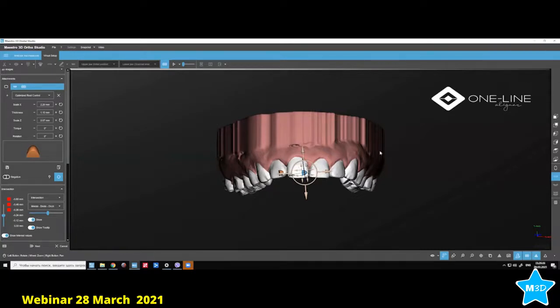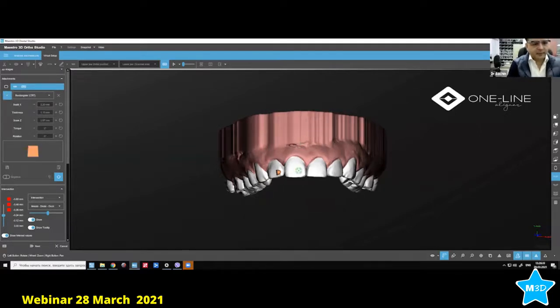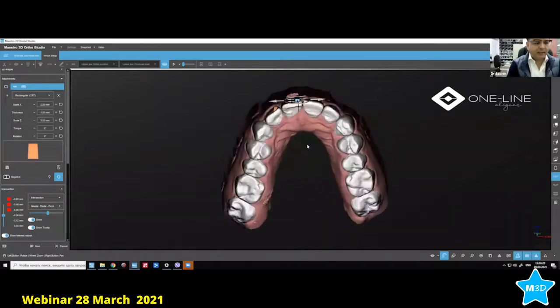Sometimes if a patient does not agree, normally I have pliers to do activations on the aligner, but you can also do a negative attachment in this case. You need a big one, because the attachment that you will get in the mouth will be a lot less.